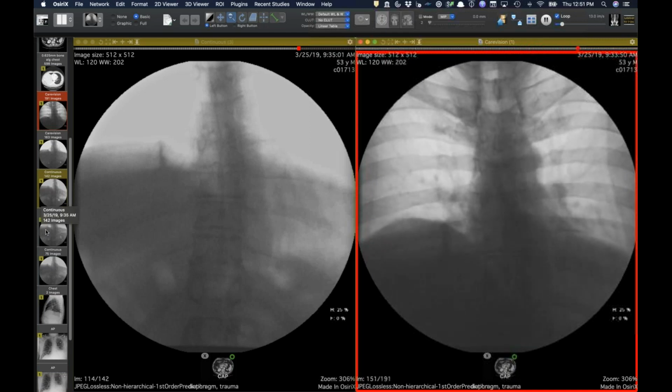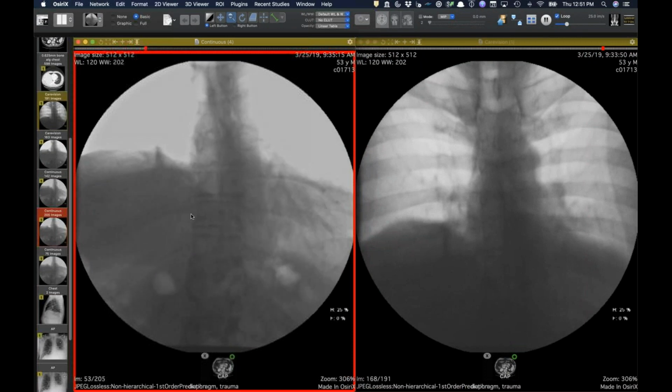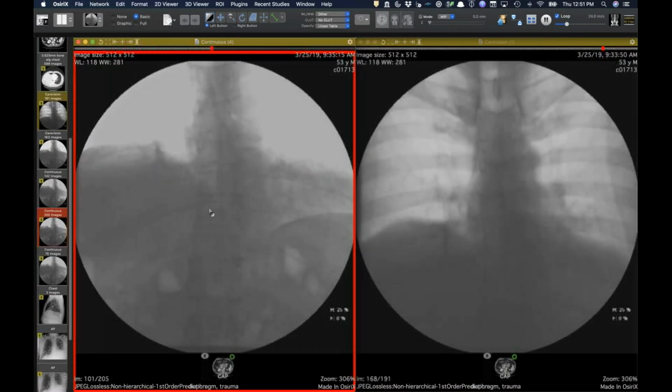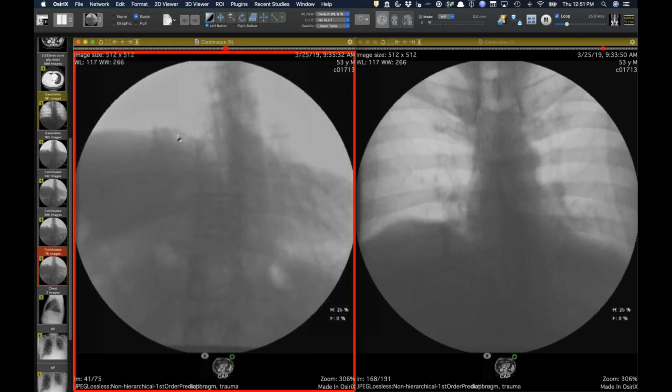Yeah. Okay. And there can be some orthograde motion that's transmitted from the other side. Usually, in that situation, the affected side is sluggish. It only follows the other side down. And I think it's just being dragged, passive rather than active excursion.